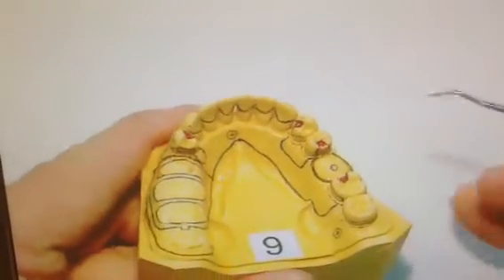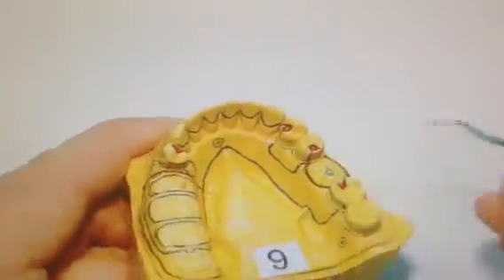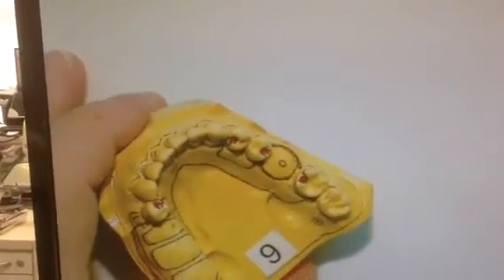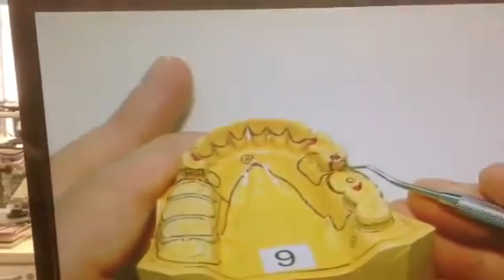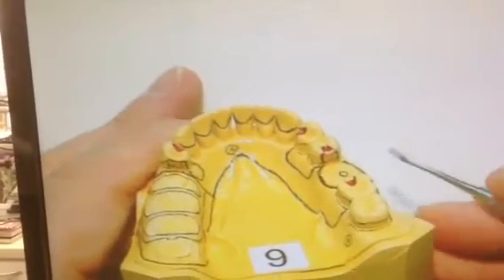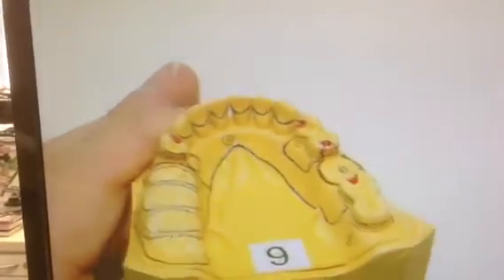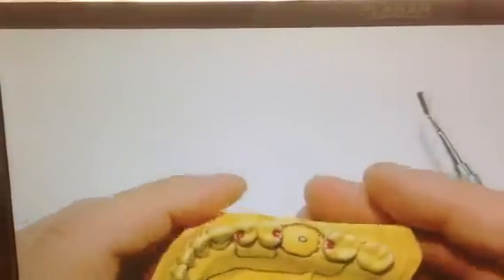Okay? Make sure you mark your guide planes. They need to be marked in red. Even if you don't do an adjustment for the guide plane. If the guide plane is already perfectly smooth and you don't need to adjust it, Dr. Smith wants guide planes marked in red. He likes them red, and he likes them with hash marks. Different schools, different parts of the country teach that differently. But for here, mark them in red, mark them with hash marks, because he wants you to know that you knew that they were there.